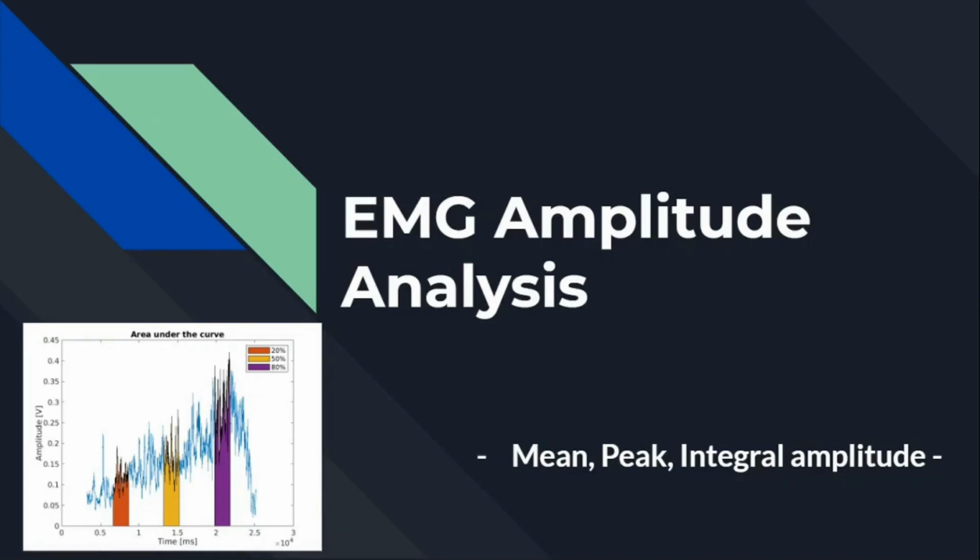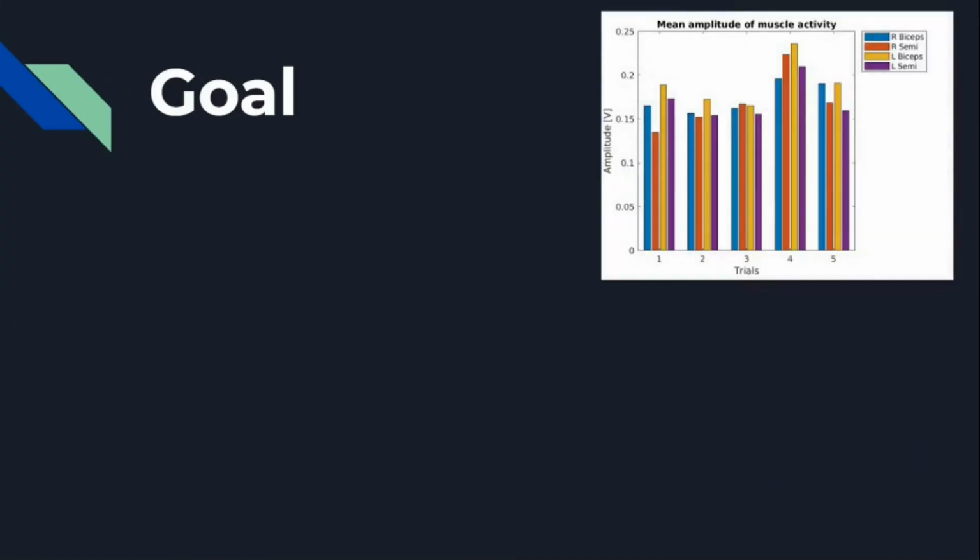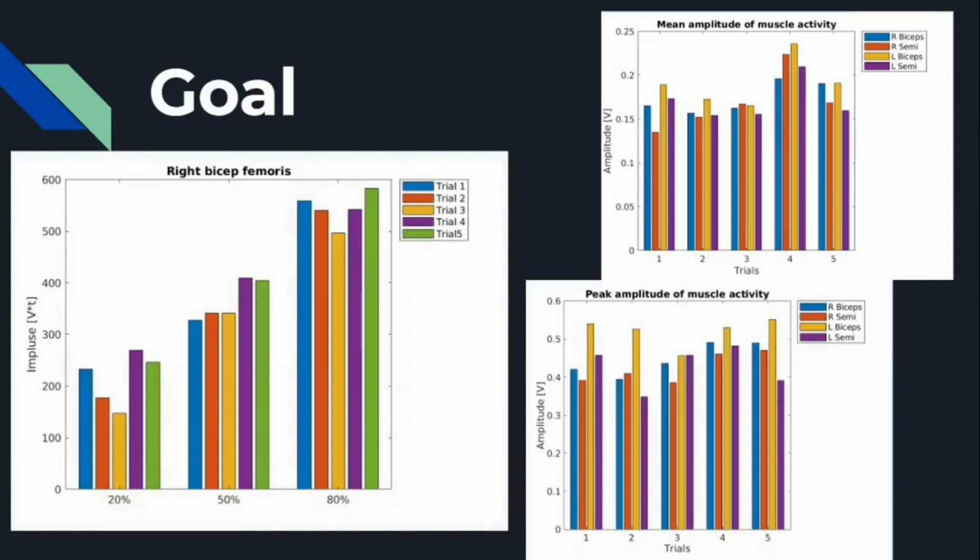Today I'm gonna show you how to do EMG amplitude analysis. Especially I'm gonna talk about the mean, peak, and integral amplitude of EMG. So the goal of this YouTube video is to make this plot: the mean amplitude of muscle activity in EMG and peak amplitude, and we're gonna find integral EMG amplitude, which is kind of the same as impulse procedure.